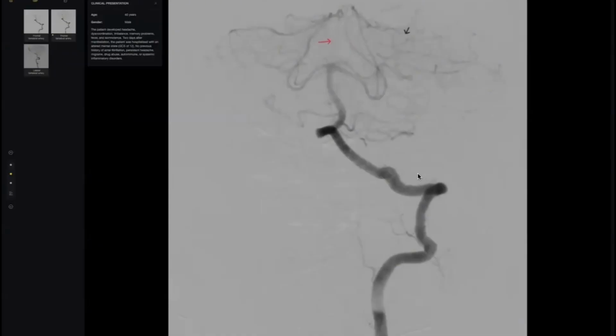So here, this is most likely the vertebral artery, and this is the basilar artery. Because there are many lesions in the midbrain, pons and cerebellum, I am thinking that some artery arising from the basilar artery may be involved, leading to such type of images.